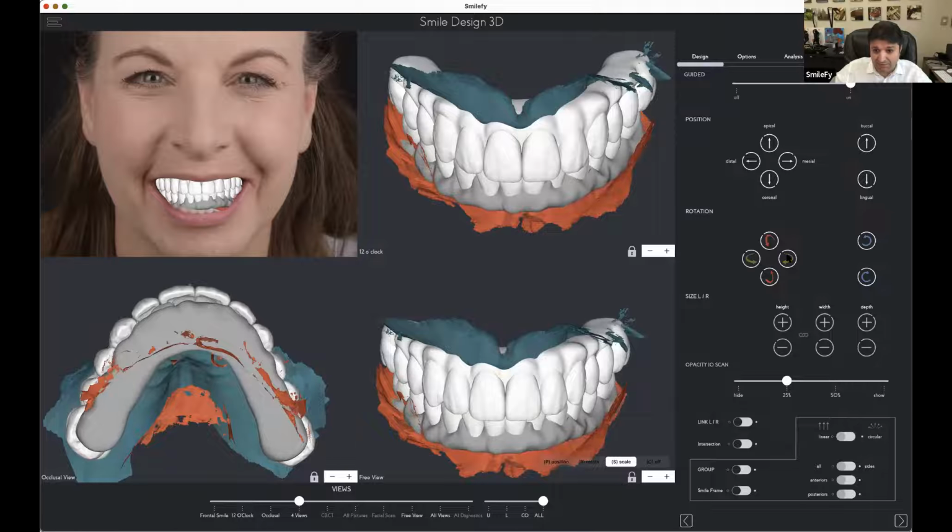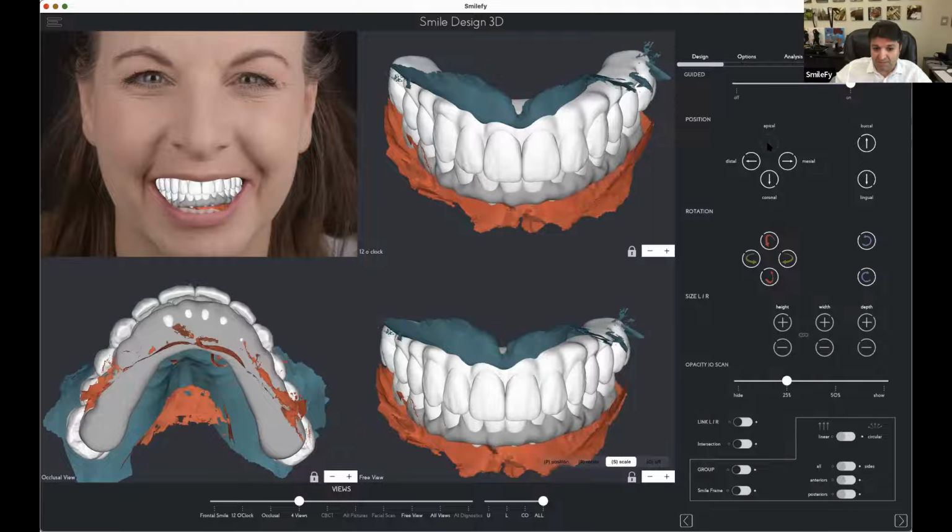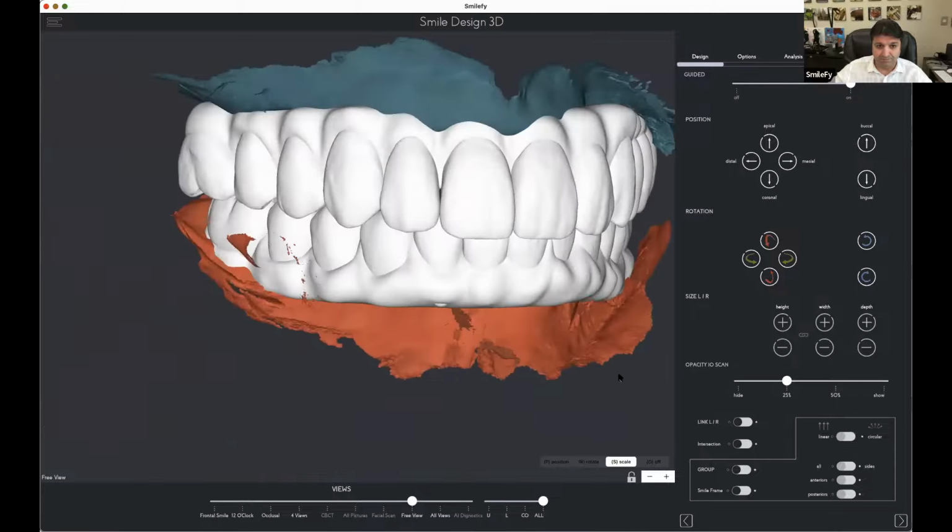and with the functionalities that we're gonna have, with one click, we're gonna adjust the prosthesis to the patient's gums. And then it's super easy, just one button, and then we do the calculations. We follow the patient's gums, and then the gums are also created super quick. Here we go.